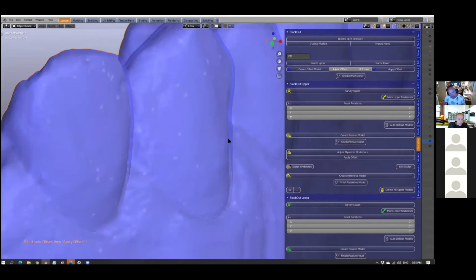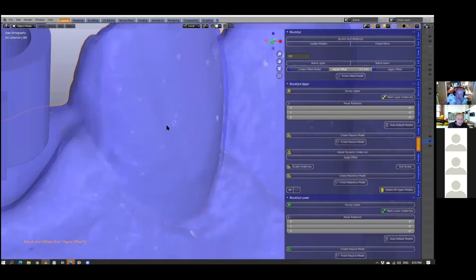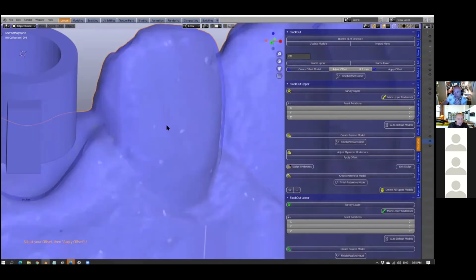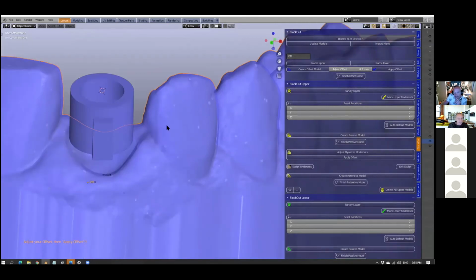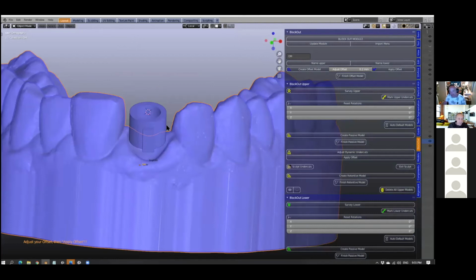So whether it's an open guide, like a skeleton guide, or a closed frame guide, we need to make the model slightly bigger because we can't have a surface to surface friction fit over the teeth because it's not going to go down in the mouth. So for printing purposes, we found that 0.2 offset is quite good. But if you're going to use CNC milling for making a guide, you probably need less of an offset because of the superior accuracy of the milling process.